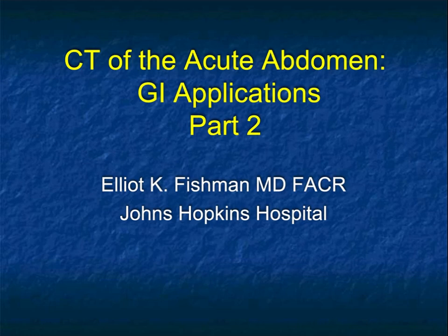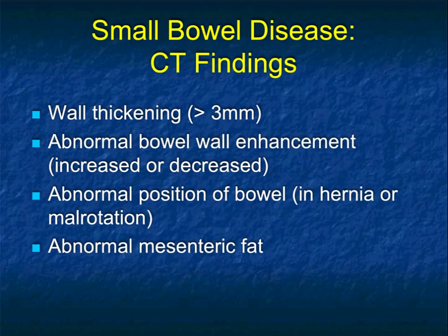In part 1, I went through a very detailed look at some of the acute processes in the stomach, from GI bleeding to ulcer disease. And let's look at some of the things in small bowel, but I'm going to try to cover some of the things perhaps you don't think about on a daily basis, but are very important to think about when you're looking at scans. So when we talk about small bowel disease, the basics.